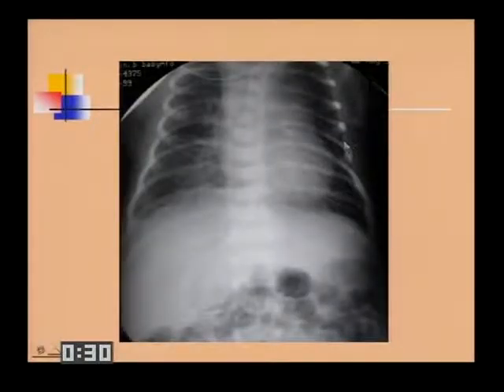This is a little more subtle. Here's a child, and we put a little bit more of the abdomen in than I've been showing you because the cardiac apex is on one side and the NG tube is going across the midline. And I don't want to tread too much on anybody else's turf. I know they're doing cardiac this afternoon.